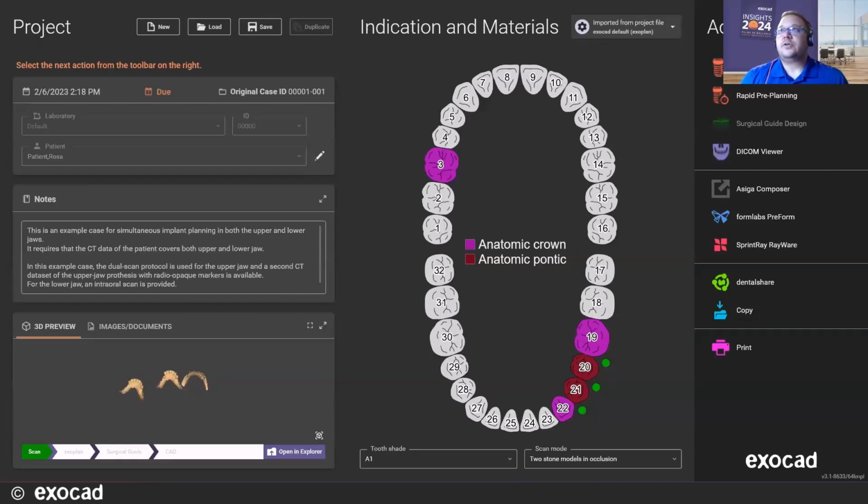The only other thing you'll notice, there's a little icon here, so that'll symbolize with all the 3.1 variants of exocad softwares, there's now a my.exocad account. So that's really the first phase for our software to move towards going dongle-less.